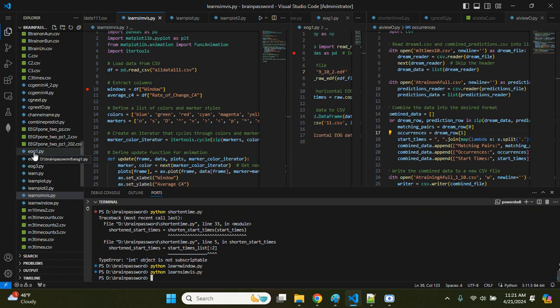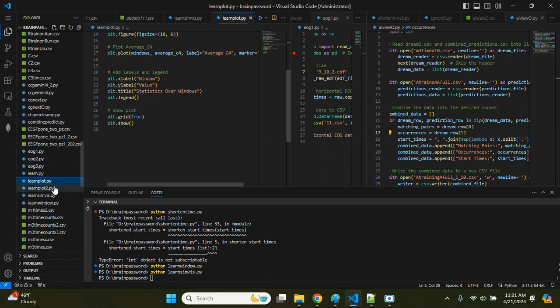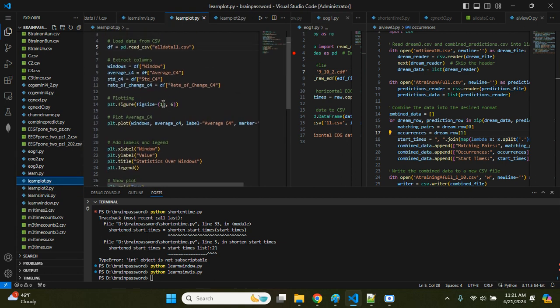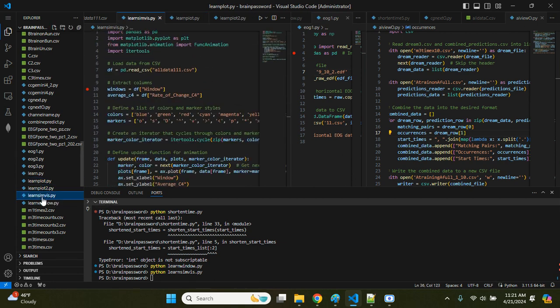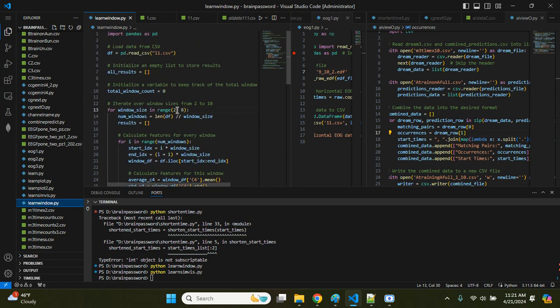So let's go back to learn. Right. Learn plot. Did I have it on 10.6? Hold on. Here we go. So I think I had it 10 to 11.